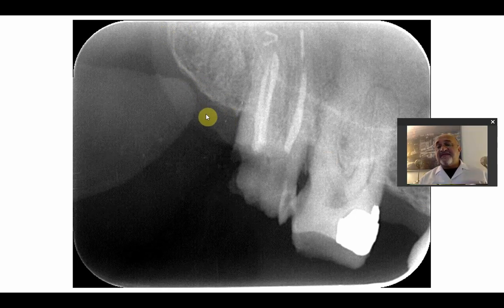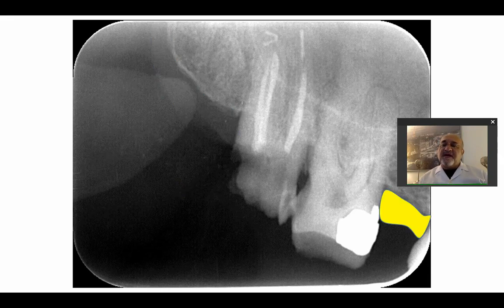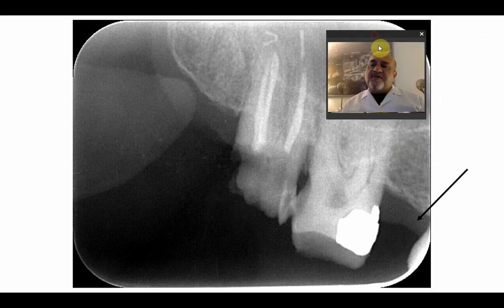When they are thick, they can stop some of the x-rays and they will appear radio-opaque. Of course, not like the radio-opacity of an amalgam filling or gutta-percha, but they will show if you differentiate between bone and the surrounding structure. So this is soft tissues of the gums or the gingival tissues that are covering the alveolar bone.